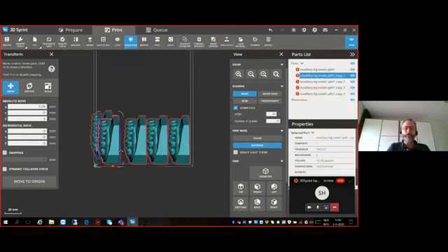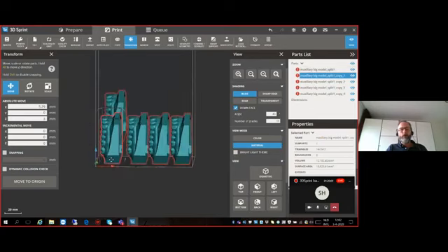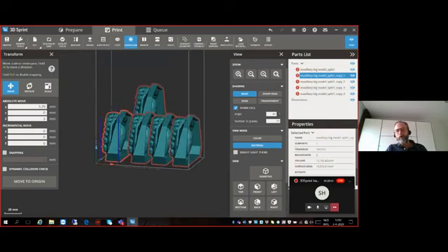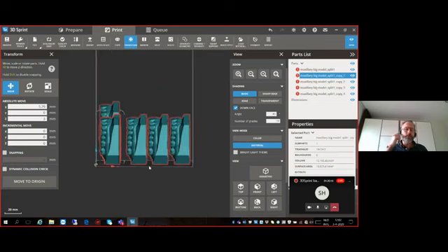And yes, we are happy to announce that we will release an awesome feature free of charge, by the way, in the latest upcoming update that's called Stacked. And what will happen is that you will load in all the different orthodontic models. It doesn't matter if they're closed, if they are, let's say, hollow to a certain degree. It will make them all the same when it comes to the model thickness. It will create supports.